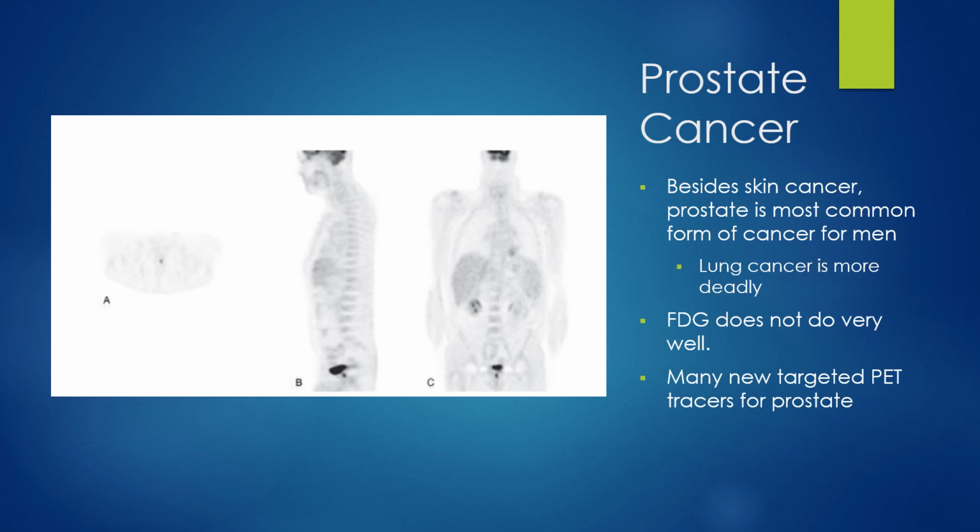This is one of the times where the doctor may order a catheter just to clear that activity out of there so they could see the soft tissue better. If the patient has an indwelling urinary catheter because of their prostate cancer, that can cause a false positive on FDG because the area around the urethra will be inflamed or could be infected, which would take up FDG. And so these are some of the reasons that FDG really does not do very well for prostate cancer patients. It gets very complicated and very hard to see that tissue around the bladder.